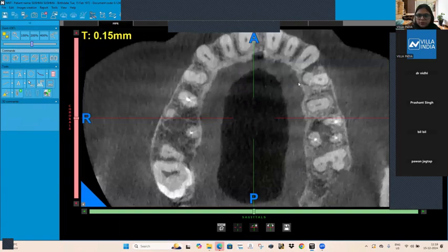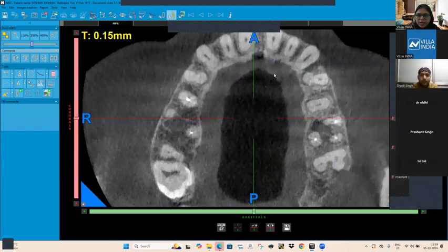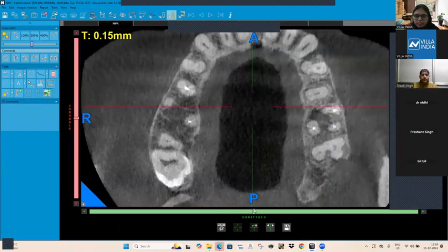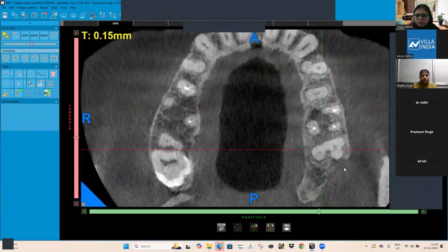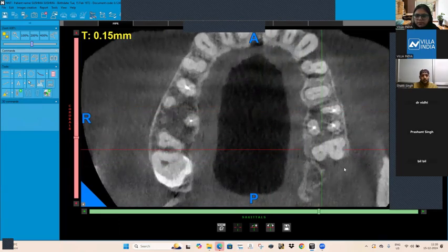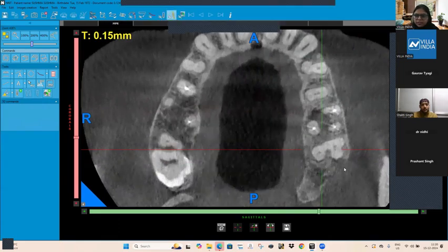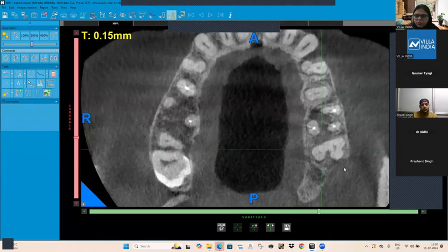Okay. So now the axial section is a little enlarged. You can see it clearly. You can see the 2-7. All of you, can you see the 2-7 here? See, I had located it. This is the axial section of 2-7, or the transverse section, anything you can say. So now, can you see the 4 openings here?